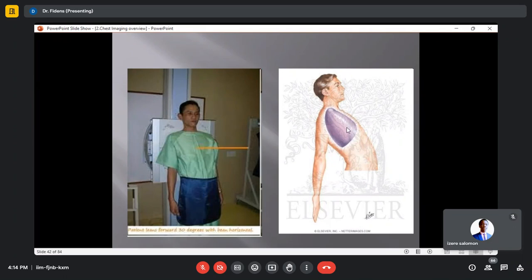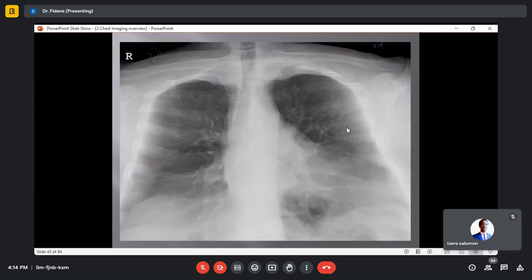Okay, the same. Clavicles are above, and the apical regions are very clear. The base of the lungs is lower, and we are not concentrating on the base of the lungs. So don't say that they are not clear. If you have made this view, we don't care about what is going on at the base because you had seen it before. We are focusing on these apical regions.